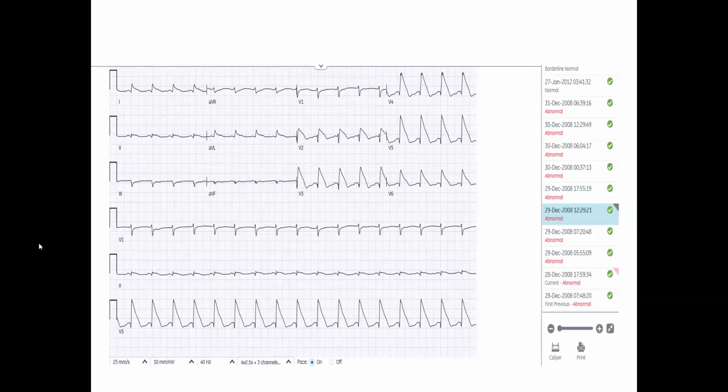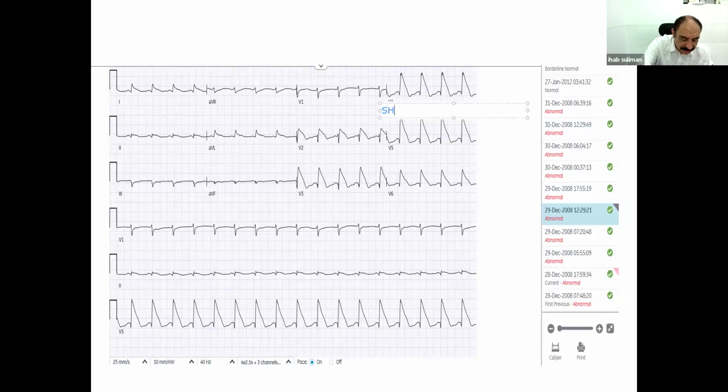Shark fin pattern. You are right, absolutely right. So it is called the shark fin ECG. And I found, by the way, TikTok clips of people eating the shark fin itself. And the other name for it is lambda sign, or it is also called giant R wave. So they say it is present in 1.5% of all anterior MI.